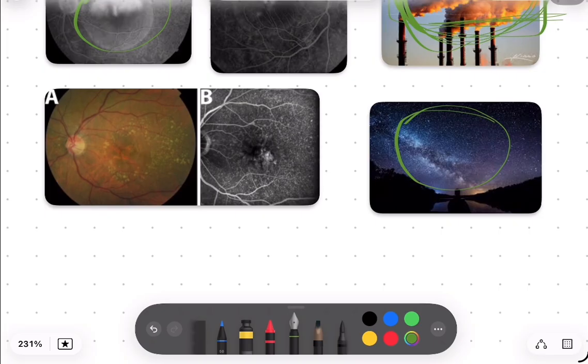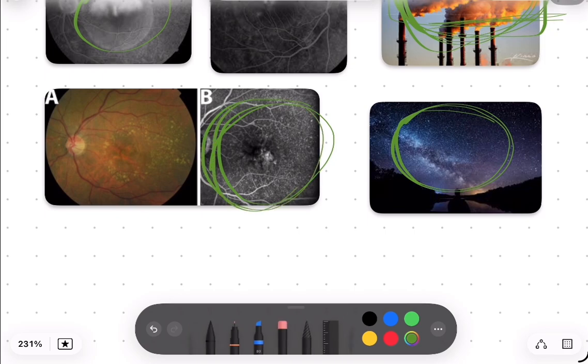But the thing is that drusen are extracellular eosinophilic deposits between retinal pigment epithelium and the Bruch's membrane. So drusen is between retinal pigment epithelium and Bruch's membrane. And on the FFA, you will see a stars and sky appearance. So can you see the stars in the sky? This reference image, and then you look at this FFA image, and yes, it does feel like there is a stars and sky appearance resemblance, and that is your presence of drusen.